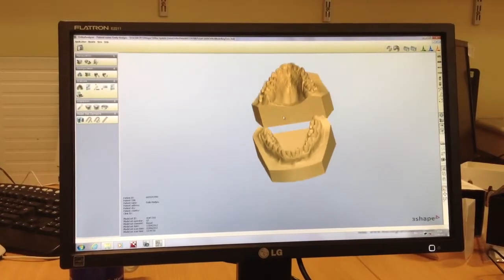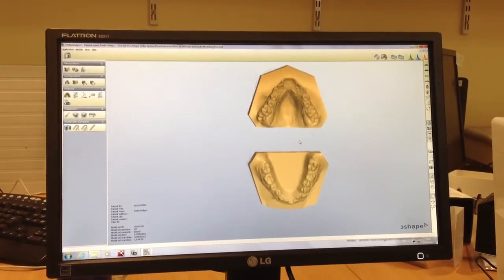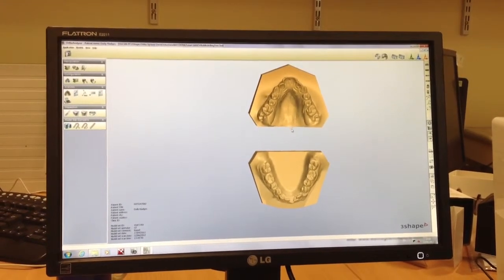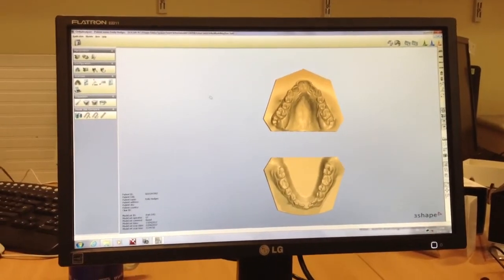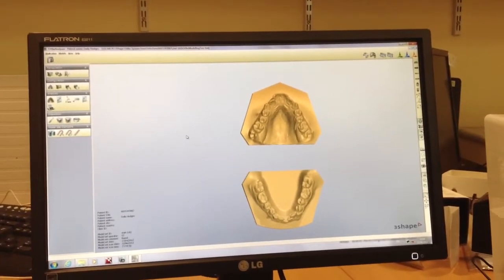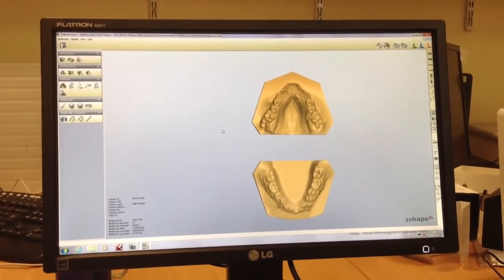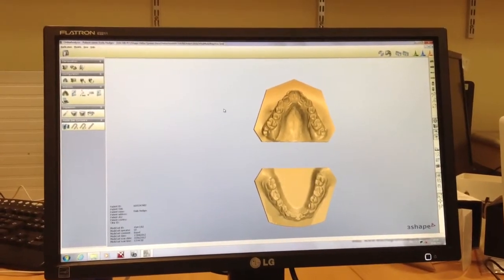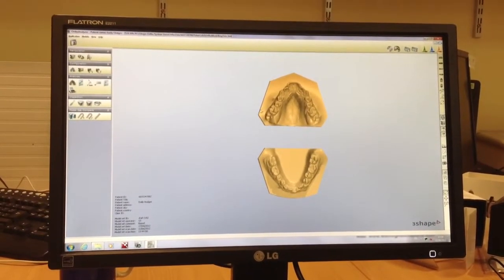Okay. So PAR scoring has subjective aspects and objective aspects. The objective bit is the aspects of the part we want to measure, so we're going to make measurements on those first. So contact points, overjet and open bite, overbite, centerline displacement. Whilst they're objective, they're kind of visually objective, really, aren't they?